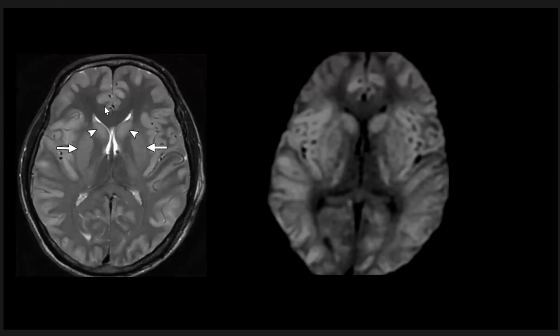Here, patient with hypoglycemia, and we have the caudate nuclei and the lentiform nucleus hyperintense or isointense to the gray matter, with restricted diffusion in this patient with hypoglycemia.